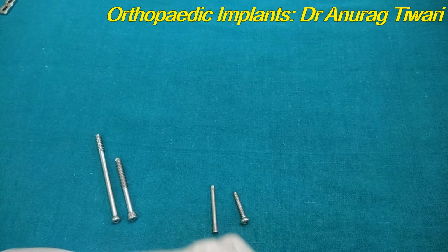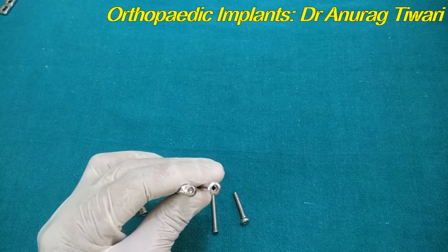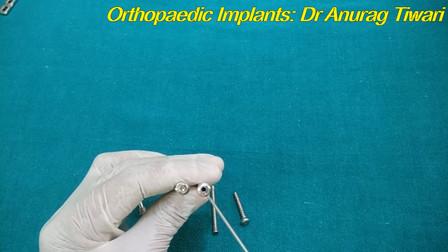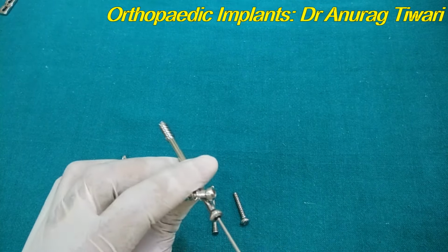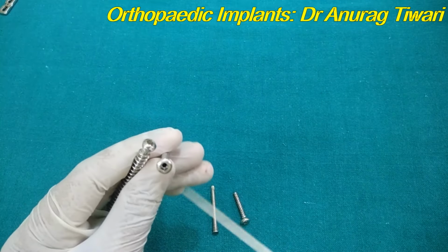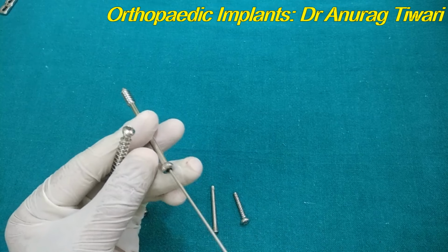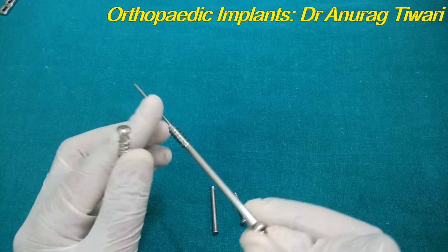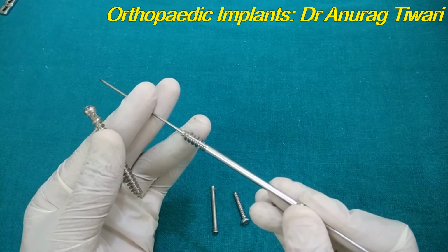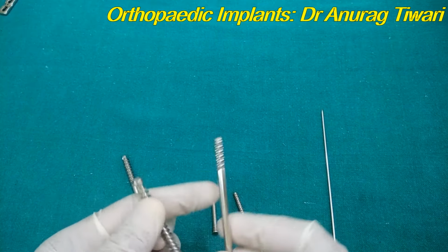And another classification is non-cannulated and cannulated, or we can say solid versus cannulated. You can see that this is the solid screw and this is a cannulated screw because it has a hole in it so that the guide wire can pass through it. Again, this is used in fracture neck of the femur, fracture scaphoid or fracture capitulum, where we first insert the guide wire, check the position over this guide wire, and then insert the screw over it to avoid multiple attempts at screw fixation.